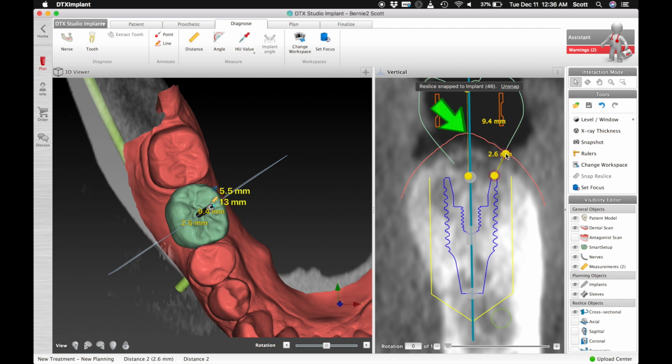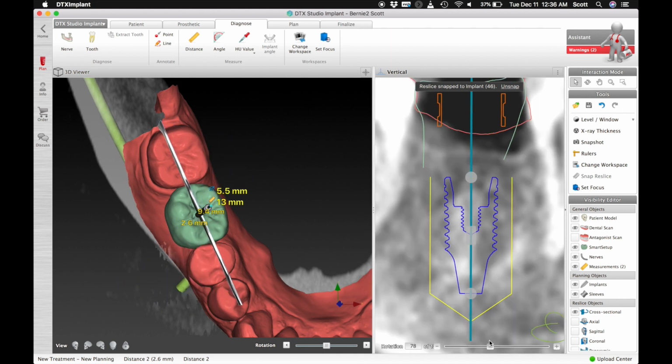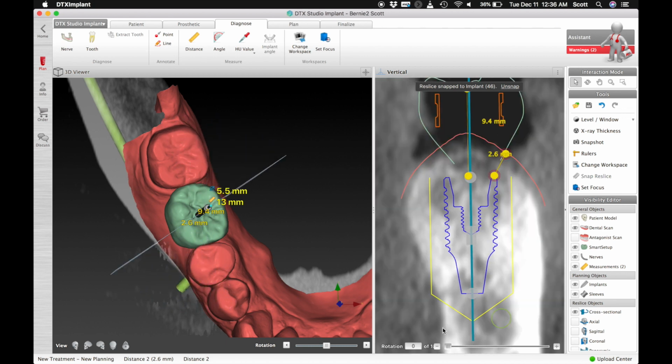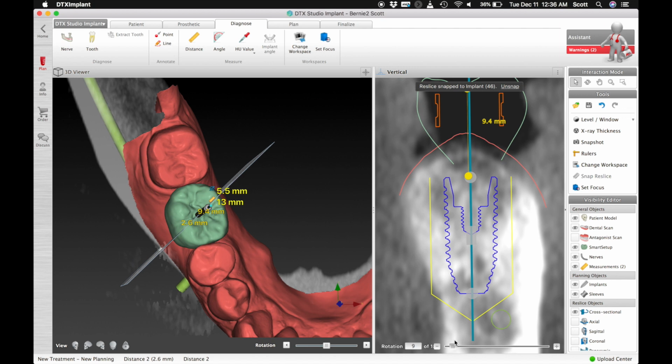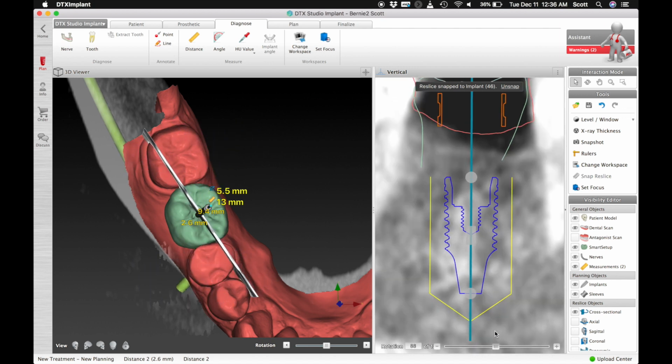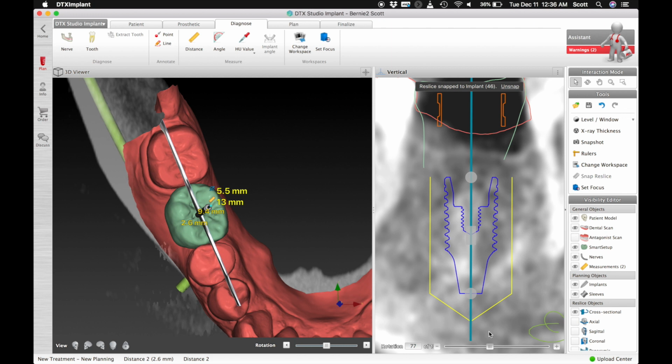Ideally I want 3, but we're going to cut here and bring this tissue to make it deeper out here as well. So I would like 3, but we start to get too close to the nerve. You know, if we could get it down maybe a little bit more like this, then I'd be okay there. So now we have that in position. Whenever we're doing it, we want to check the position after we're done to make sure when we move something.